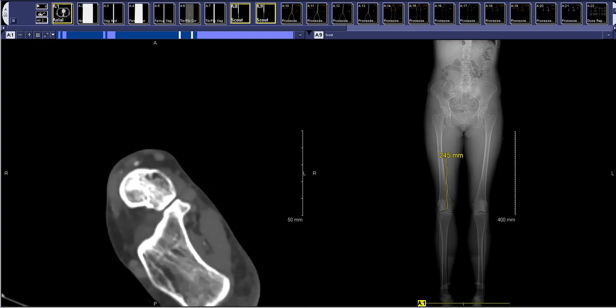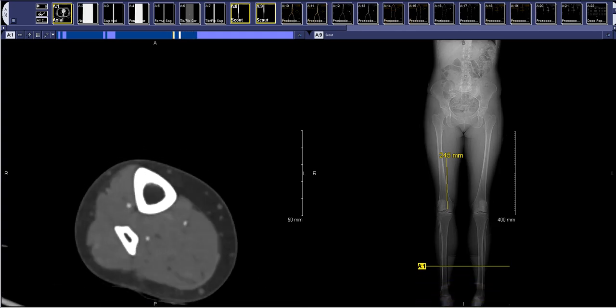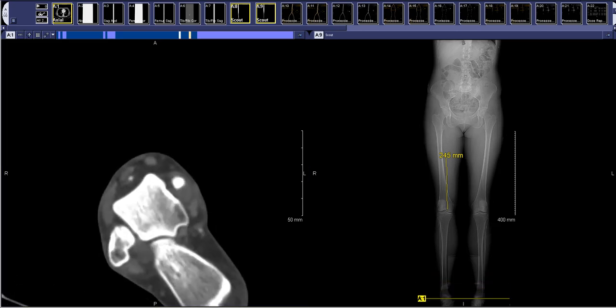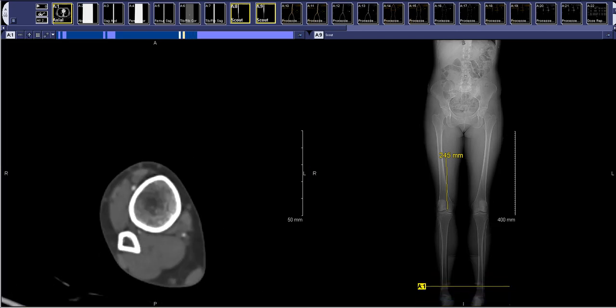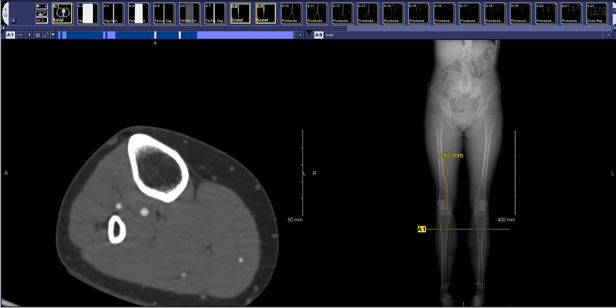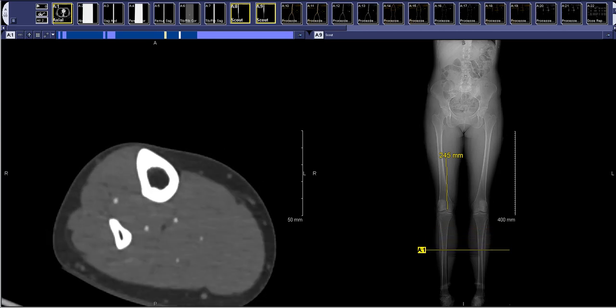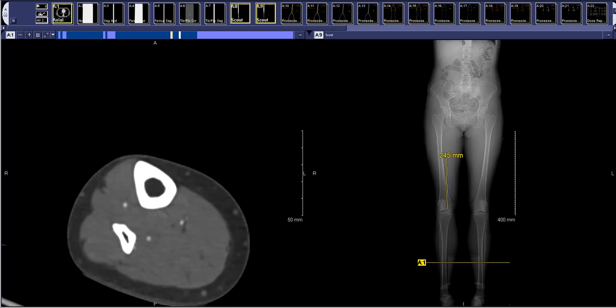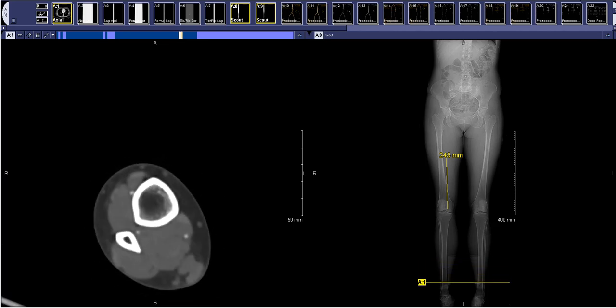It's important to describe bilaterally what runoff there is to their feet. Frequently in diabetics or vasculopaths, you'll have single vessel runoff where the AT, PT, or peroneal artery will completely thrombose off in the upper calf. And so a typical impression for a report like this would include, like, patent 3-vessel runoff to the right foot, if all 3 vessels are patent, or a single vessel runoff to the right foot, because ulcers are more likely to occur the worse peripheral vascular disease you have. So if someone has a single vessel runoff, it may account for a diabetic foot ulcer, for example.